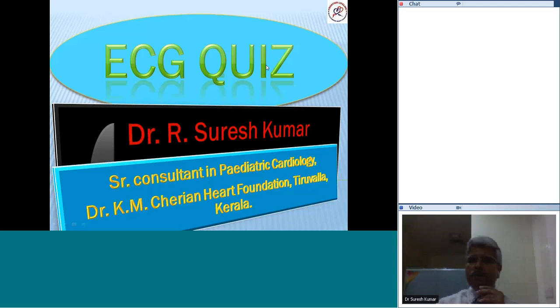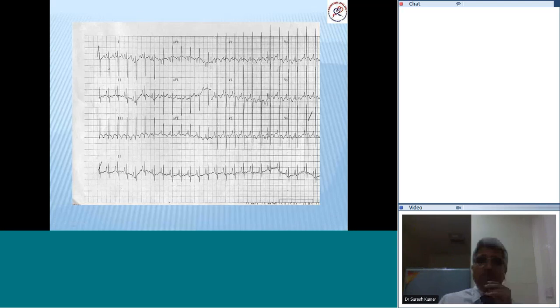Look at this ECG. I want you to enter the findings and the diagnosis. You have 30 seconds. There's nothing great. All of you would have seen this. No takers?